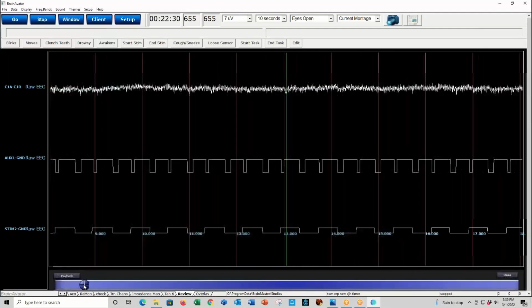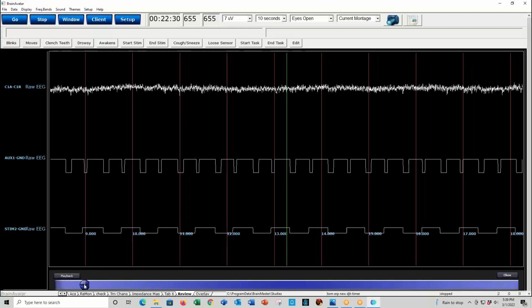So as you're going along, we have the checkerboard flashing with a period of 0.4 seconds. And when the checkerboard flashes in one sense, you get a long pulse here. And then when it flashes in the other sense, then you get the short pulse because the checkerboard has two senses, A and B, basically.